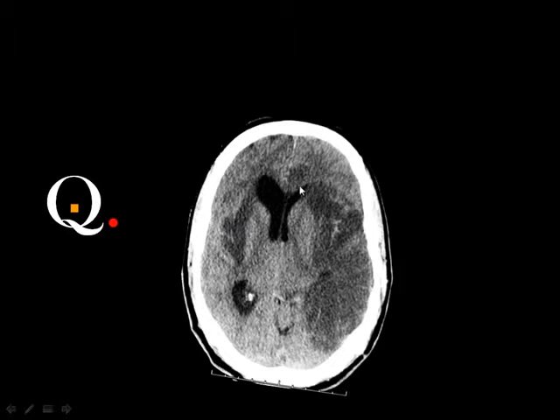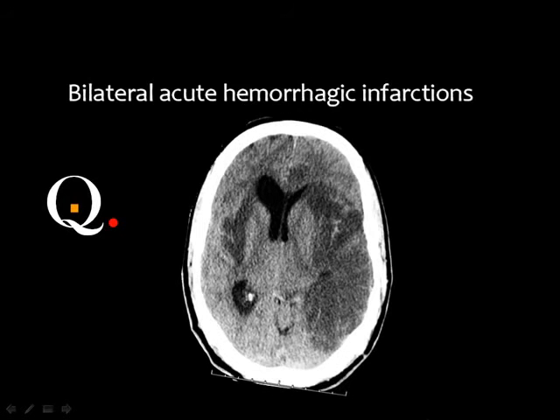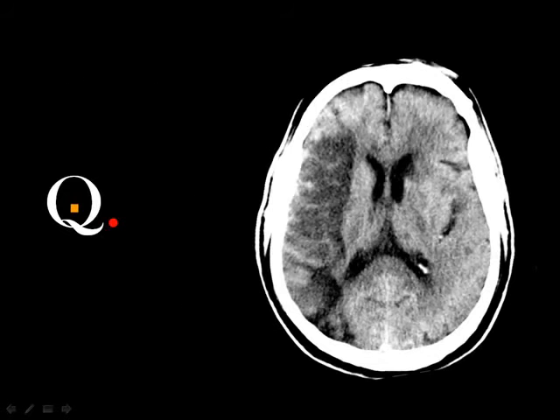Actually, this ventricle is compressed, then you know that this is acute infarction. But you don't know if this ventricle is normal, because the patient had some atrophic changes, or if it is dilated secondary to the presence of this area. Then we consider, if they have the same density, we consider them as both acute infarctions. Okay. Then what do you think of this?